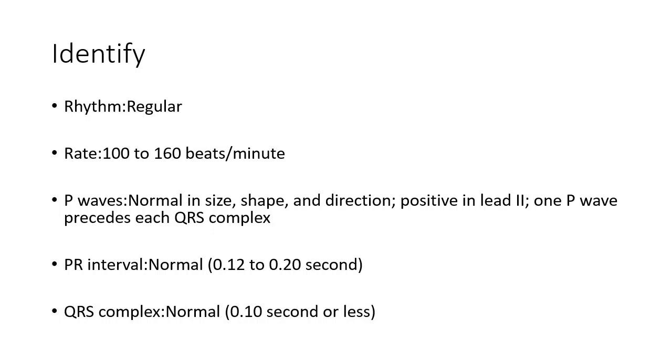Is this just sinus tachycardia? Yep. Just sinus tachycardia. Joe, what's the significance of the positive in lead two? Or is that just there?